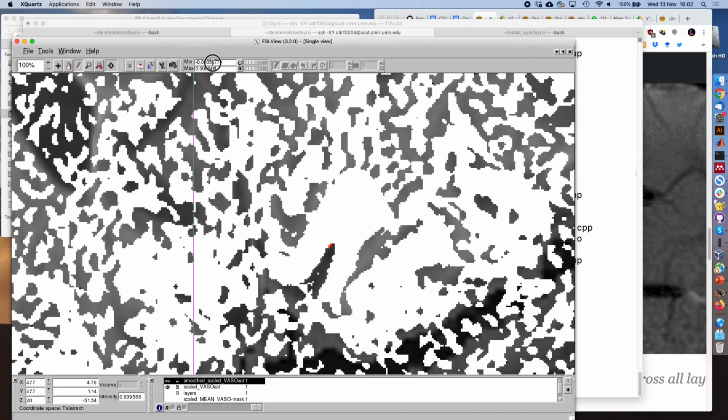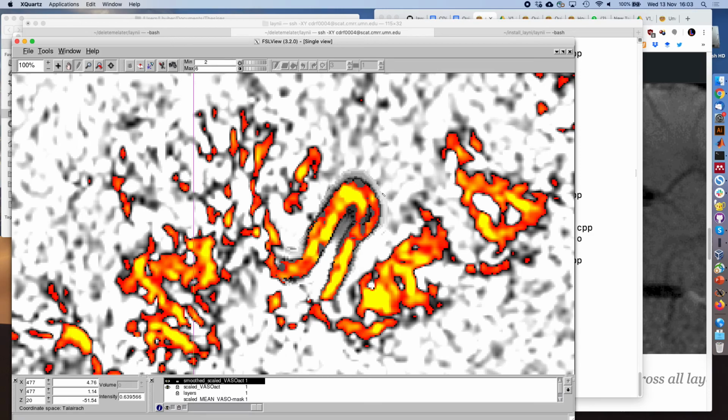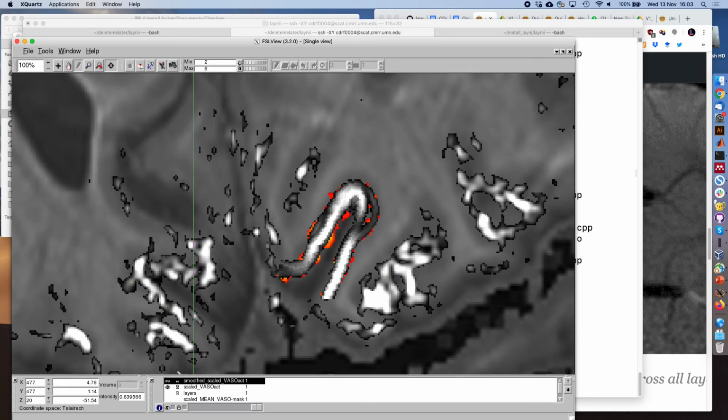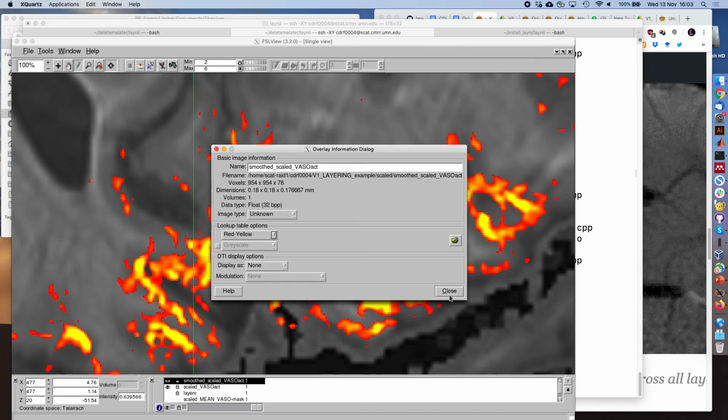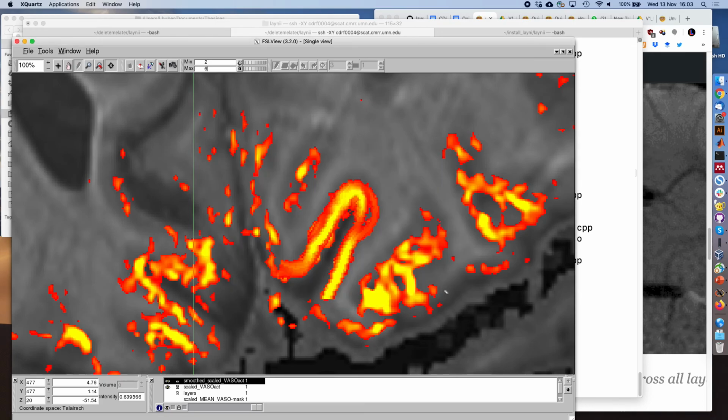Well, this is the upsampled, so interpolated, not on the original grid. Earlier we looked at the original grid with 0.5, and this is now 3 times higher, so that's why it looks smooth.